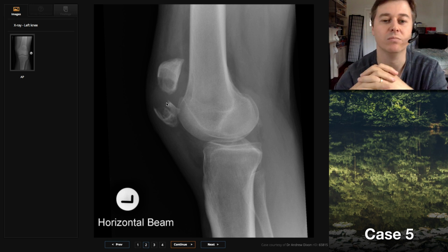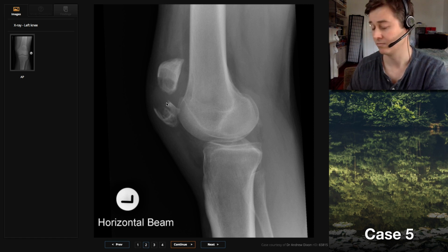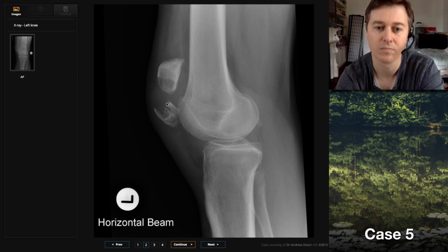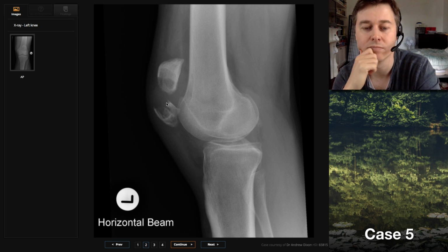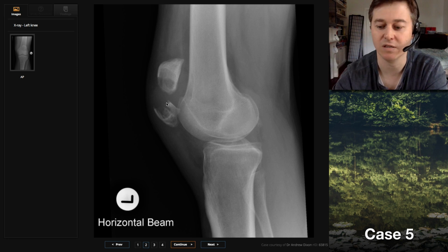Okay, and what do you think the most common kind of pathologies might be? Non-aggressive lucent lesions would be things like an aneurysmal bone cyst, a GCT, a giant cell tumor, and then there are still the malignant causes that can cause this appearance, like mets, myeloma, lymphoma in an adult patient. Yep, that's a pretty good list. Chondroblastoma is probably the other thing that can occur in the patella and look like this.